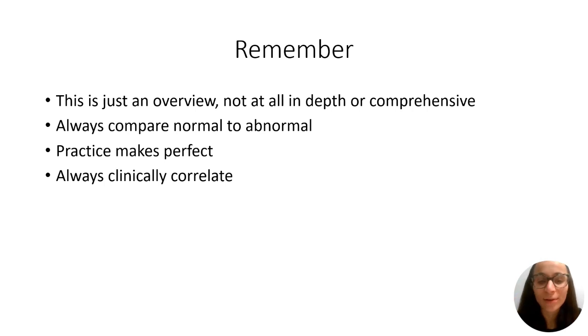So just reviewing, practice makes perfect. And like I said, this is no radiologist review. This is just if you want to quickly understand how to read a CT, you're looking at your patient's imaging, you want to just understand what's going on.